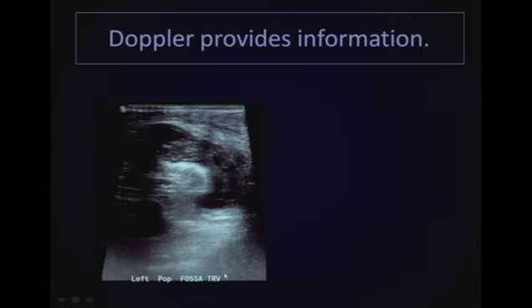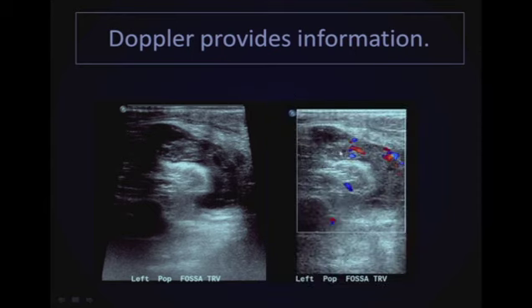This is a patient who presented with acute calf pain. We see this frequently with DVT studies, but here we have a fluid collection in the expected location of the semimembranosus gastrocnemius bursa. So this is a Baker's cyst. And is this blood within the cyst? Was there an acute hemorrhage within the cyst? Is this debris within the cyst? But in this case, there is actually a lot of Doppler flow within this tissue because this is synovial proliferation within the cyst in this patient with rheumatoid arthritis.